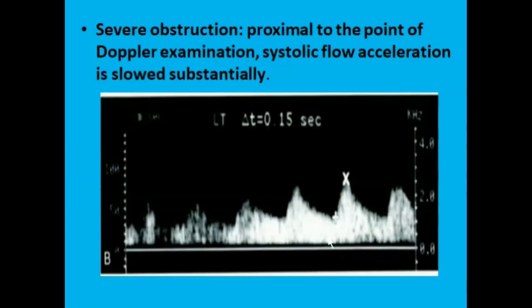In this image, we see that acceleration is started here and that is going up. It is not a vertical deflection, and the time of acceleration is 0.15 second, which is almost double the normal value, which is 0.07 seconds.